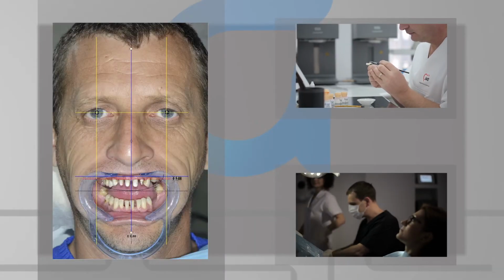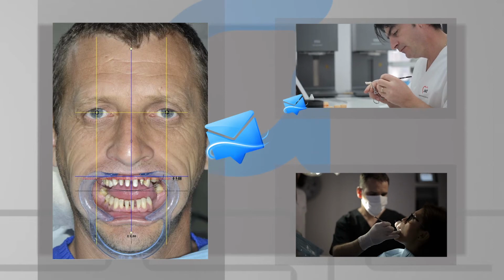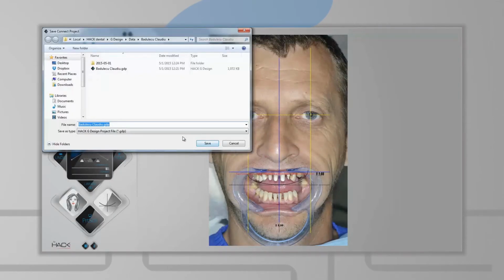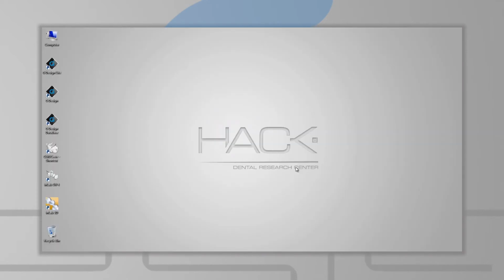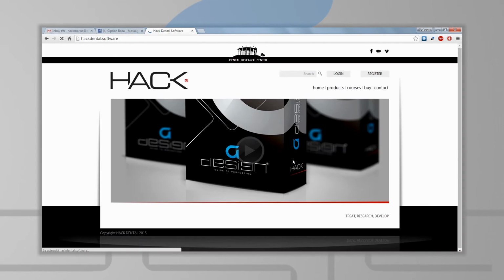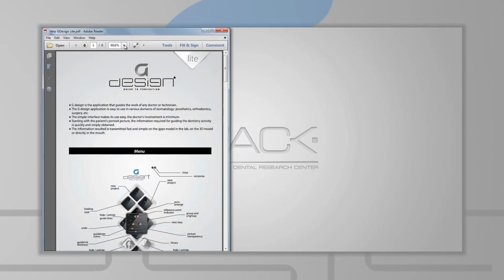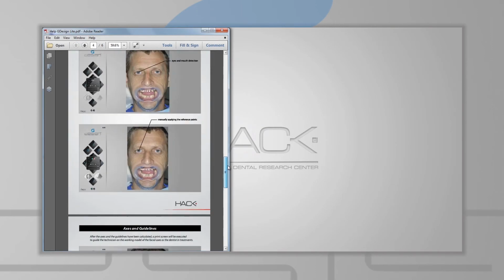The image can be sent via email or any other method to the laboratory or to fellow dentists. Press Save and choose the target directory to save your project. By pressing Open, you can open one of your previous projects. Press Info for more information. An ample guide for using this software can be found in the document named Help in your G-Design Lite pack.